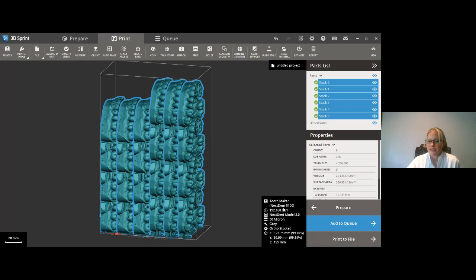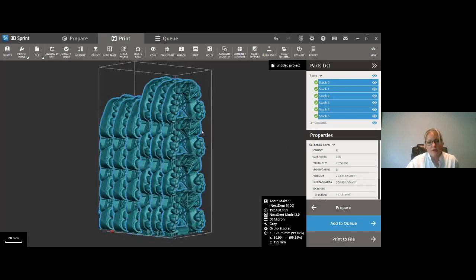Yeah, and just keep in mind that I am slicing for a specific projector on my printer, so it may be slightly different because my printer came in calibrated for that specific projector. So I am always slicing for that printer. Exactly. Well, this is also something very interesting.